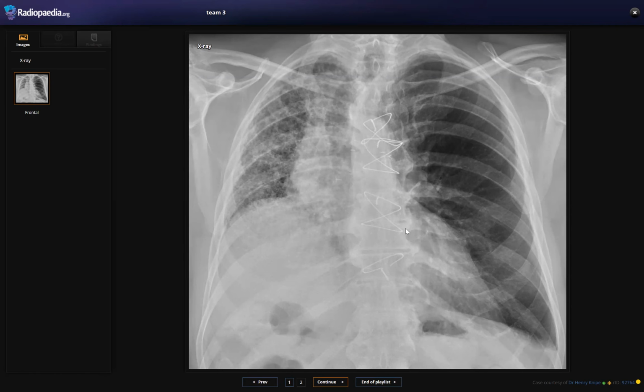Yes, as you mentioned, exactly this unilateral transplanted lung on top of UIP. Exactly, you perfectly described it. Sometimes, not even sternotomy, you might see only surgical clips. So take care of surgical clips along the hila and the unilateral transplanted lung.